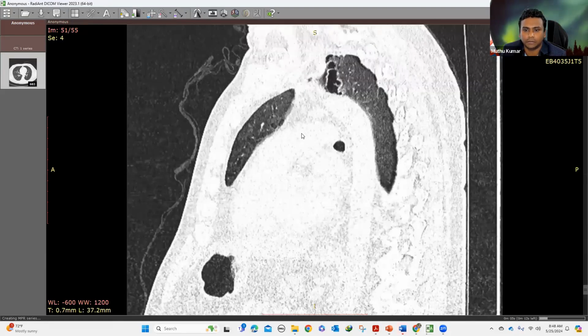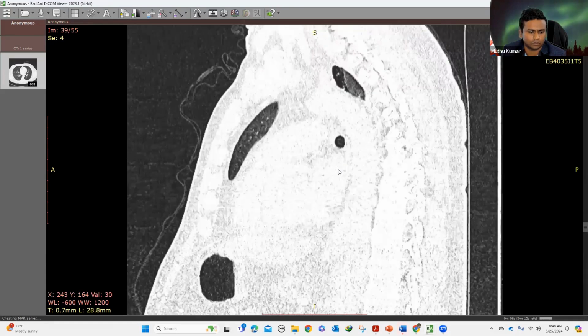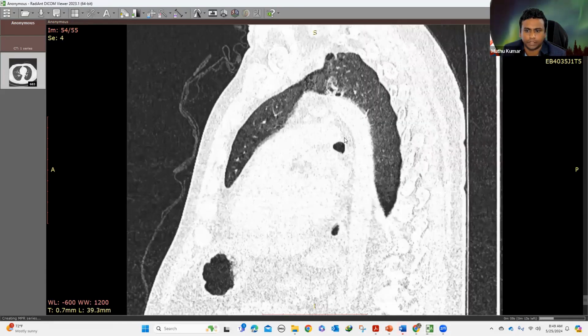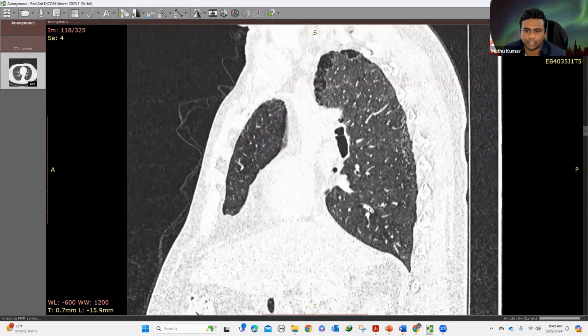Oh, it's still creating. Sorry, just give me a minute. Okay, we have proper sagittal.